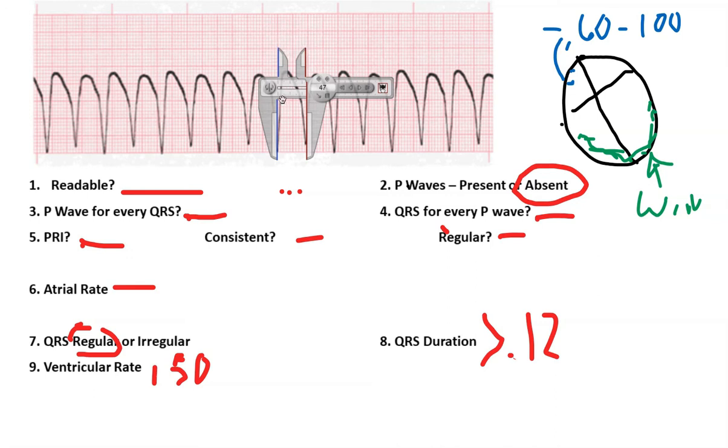I should be pretty good with that, now showing me that I have a wide QRS complex, and that becomes a hallmark right here: I have this wide QRS complex, and I have a rate that is somewhere around at least 150 or greater. Usually it's 150 or greater that starts to make it ventricular tachycardia. So it tells me again that I am dealing with a ventricular rhythm. It is the width of the QRS complex. Remember, it has to be greater than 0.12. And I also am looking at a rate that is typically greater than 150. And I like the fact that it is also regular.